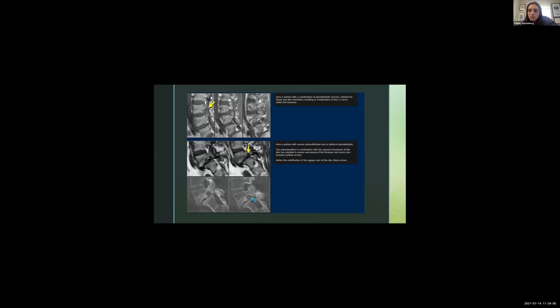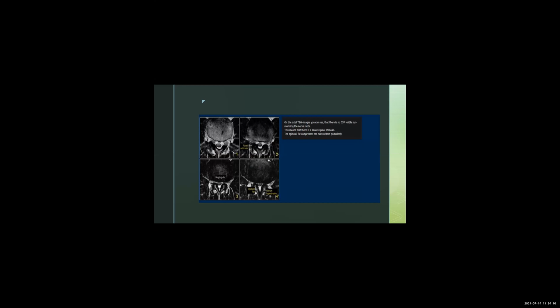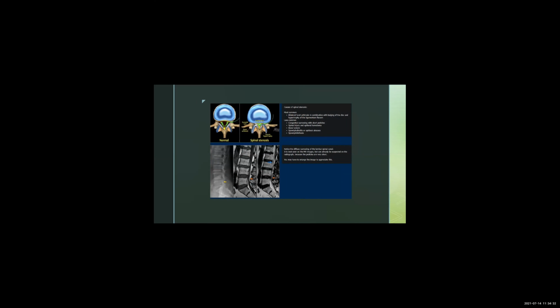I saw someone asked what could cause spinal stenosis. Sure, I can go into that. I'm just going to go back to this. Many things can cause it, for example a tumor, but most commonly it's degenerative change. Let me just go back to this picture here and blow this one up.